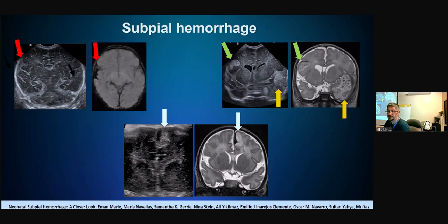I think they should have found a better name because, as you can see here, there's hemorrhage and this cortex is not normal. So there is this venous infarction here and also hemorrhage over it. So this is usually poor prognosis. You lose these neurons.